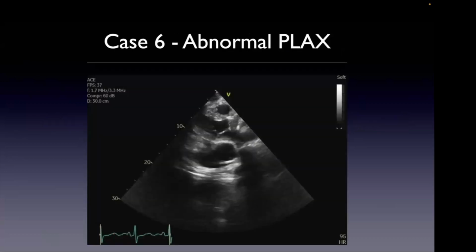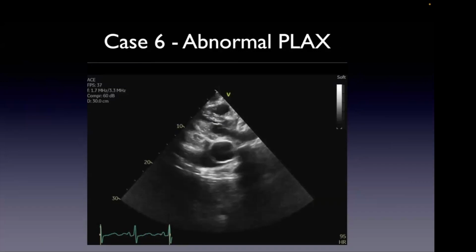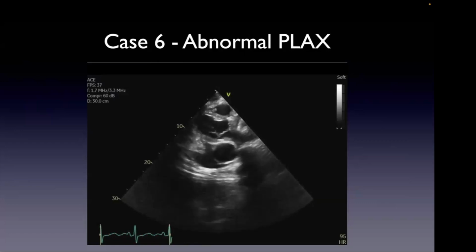All right. What the heck is that? The coronary sinus? The coronary sinus is in the differential. It's huge. So the only issue, if there's a reason why it's probably not the coronary sinus, what's the reason? So where's the coronary sinus? Right, it's in the AV groove. So this looks anatomically like it's extracardiac.